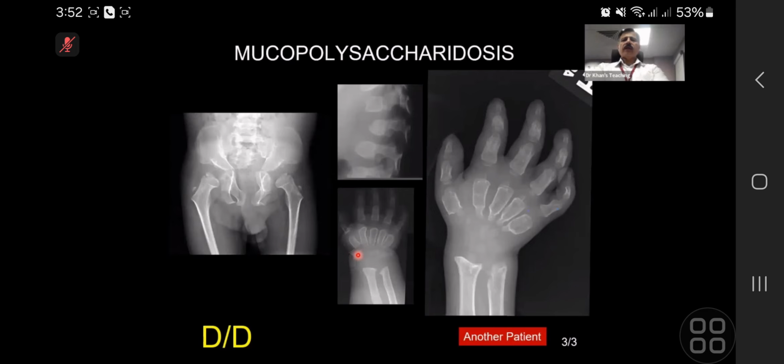Key findings for the exam is the vertebrae. The vertebrae will be abnormal. They can be bullet shaped, as in this one. And there can be anterior beaking, which can be at the inferior edge or middle portion. And there can be various other non-specific findings. Epiphysis will be abnormal, metaphysis. The long bones can have this tubular appearance. You got it right, that there might be subluxations here. There can be simian pelvis. With that, there will be fragmentation of the epiphysis.